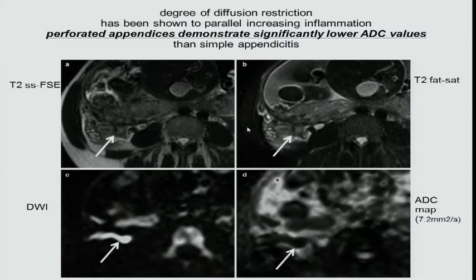And what that helps you with is something called T2 shine through. So you kind of have to look at both of them. You look at the DWI, and then if you're concerned that the signal that you're seeing is actually just T2 signal, you can look at the ADC map to help you out. The next 3 times you hear that, it's going to make more sense.